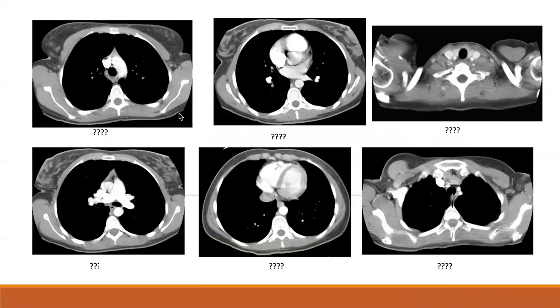We're looking for the scapula, we're looking for the humerus, because remember the patient is like this, right? So here it is, this is the cervical level. We have the scapula, we have the humerus, and then we have these vessels. Remember these vessels: we have the internal jugular, we have the common carotid, we have the thyroid, which would be enlarged in what? It would be a goiter, an enlarged thyroid, and you would get that in iodine deficiency, or in Hashimoto's thyroiditis. And you have the trachea, right? So those are most of the big structures for the cervical section.